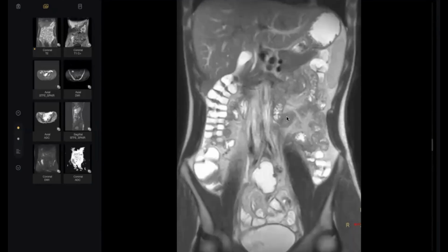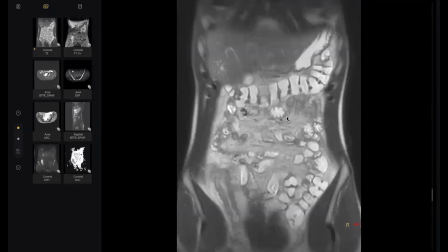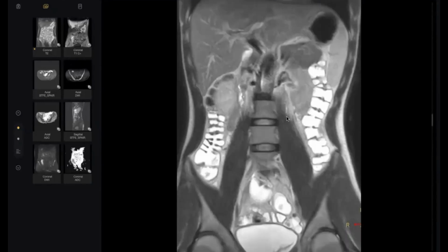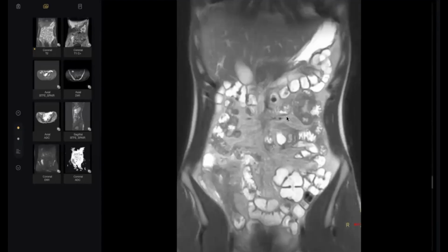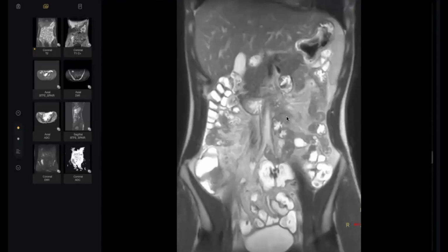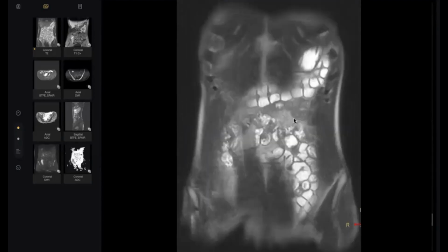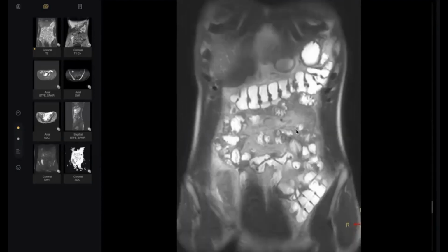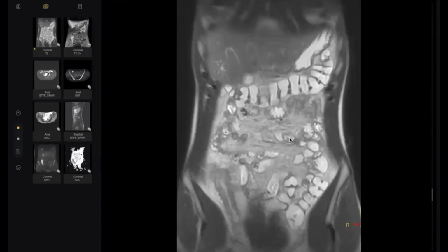Okay, but you were right in the beginning. This is MR enterography. You are right. See, the bowel is distended by fluid, so this patient has been prepared. This is intended preparation. Look at the colon, and even the small bowel. This is prepared, so this is MRE or MR enterography. Trust in your first answer, my colleagues, as I mentioned many times. Go on, doctor.